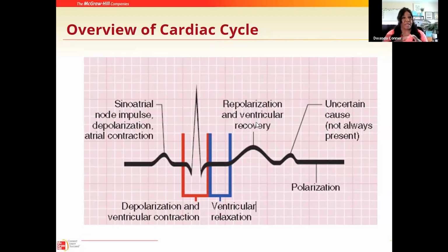So now we've had the contraction of the heart as well as the relaxation, completing one full cardiac cycle, which would then take us to the U wave, which is not always present, but does represent repolarization, and the whole cardiac cycle continues over and over again.